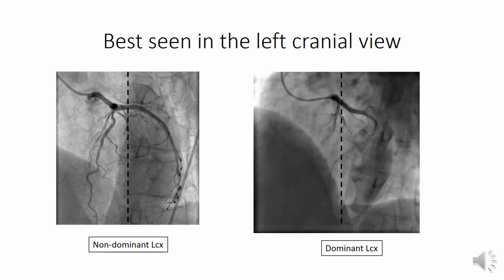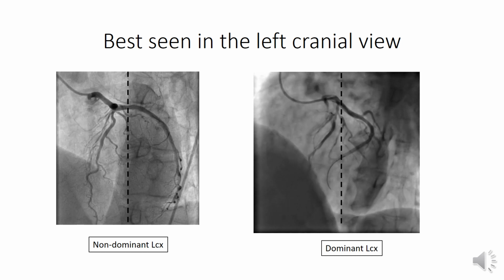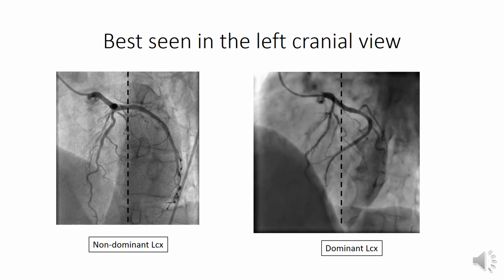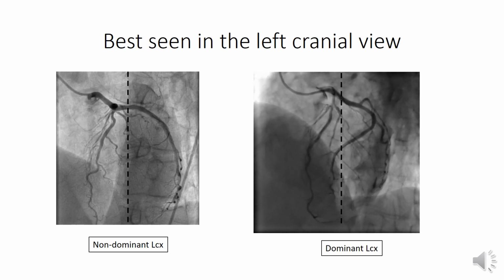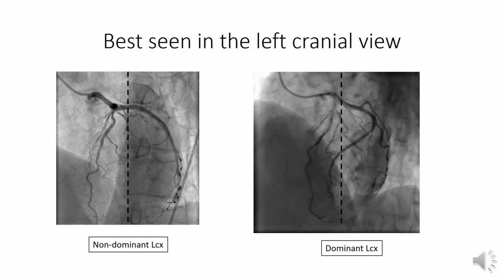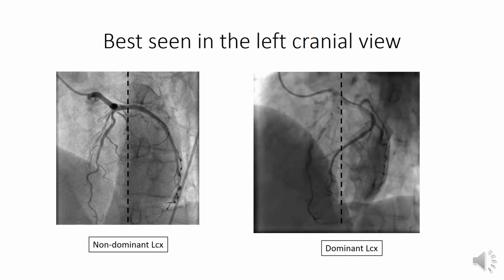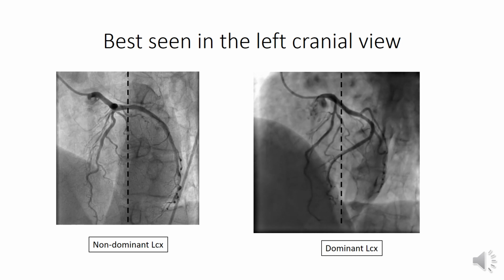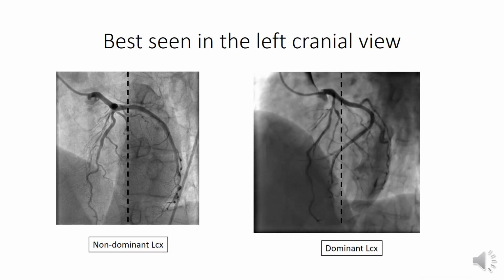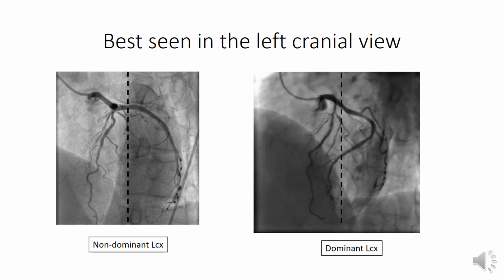In this example, this is the left main, and here is the LAD running along the picture in the interventricular septum, and here is the circumflex artery. We look if we see a branch that crosses the midline and runs on the posterior surface of the septum, or in other words, a posterior descending artery. This means that the left circumflex is dominant, which is the situation in this patient.